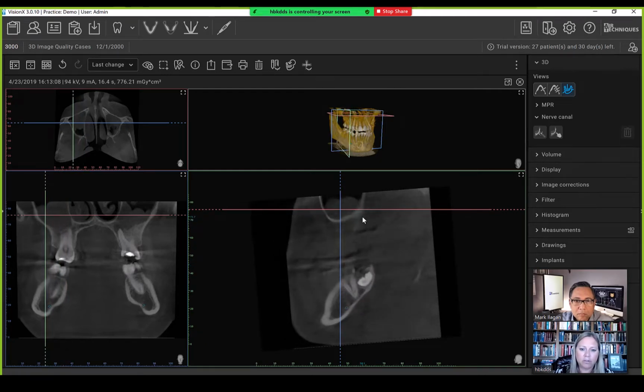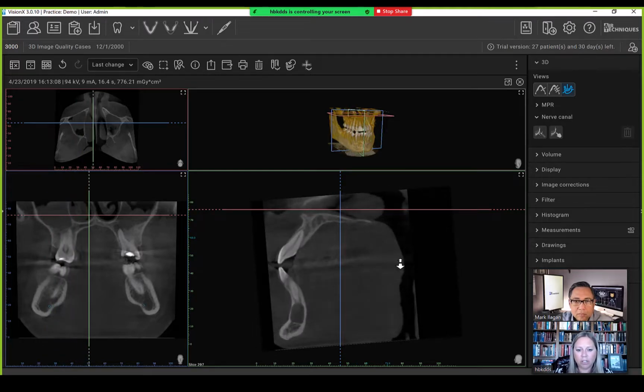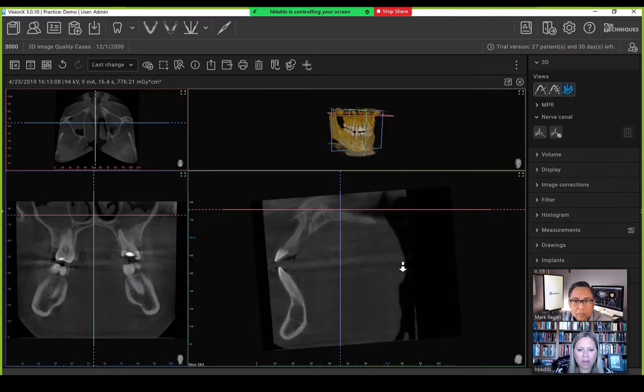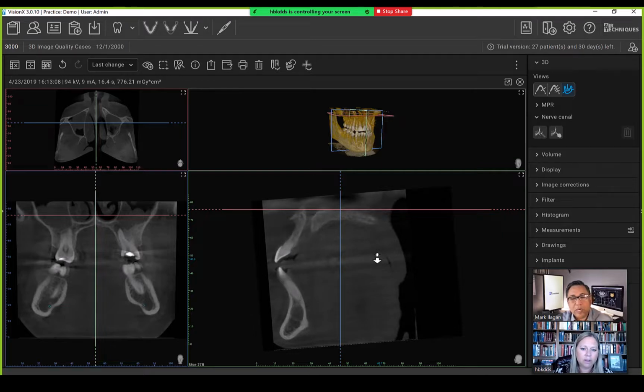And again, over to that right hand side of the maxilla. And then I typically do one swing through just looking at the midline structures. So I want to make sure that my incisive canal looks pretty good, nice straight canal, and we don't have anything in here that looks like a cystic process. In the larger views we would look at cervical spine, sella turcica, and that sort of thing. Making sure those midline structures look good. And then we're done.